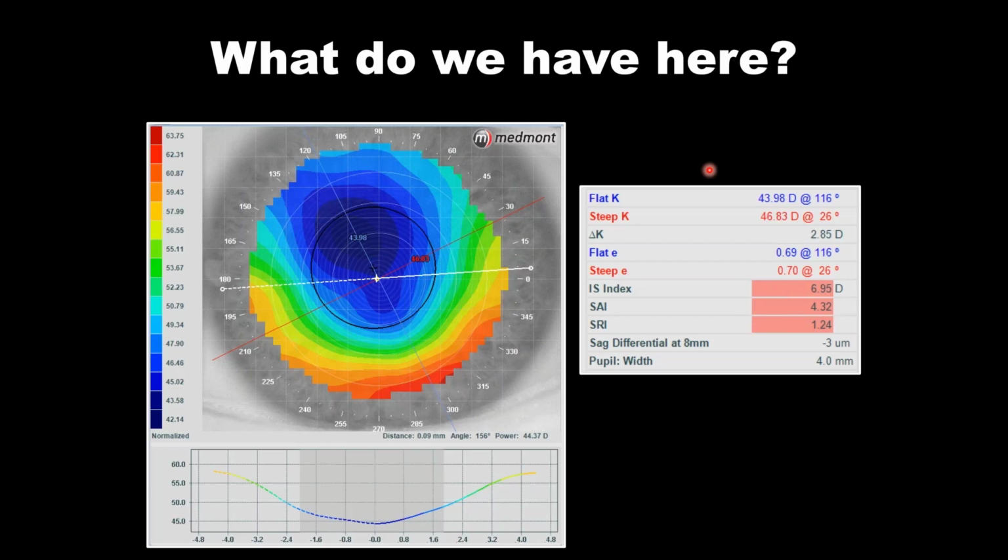Well, the story, of course, is this is a corneal transplant patient, and the rings are being lost as we hit that host donor transition area. Now, we could have done a composite topography to see if pushing the rings to the peripheral cornea would have allowed us to get a little more information. But this was a screening visit, so we didn't spend any extra time on doing that composite topography.